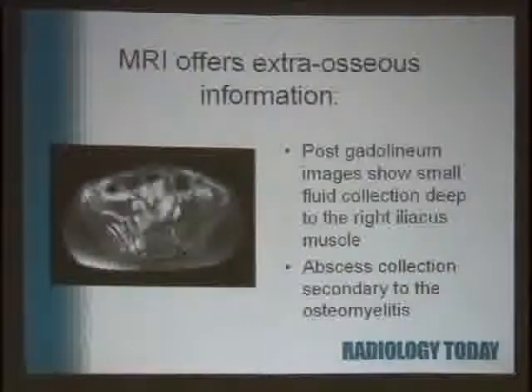A bone scan would have shown all this activity, and you would have known he had osteo, but you wouldn't see the soft tissue finding of the abscess.